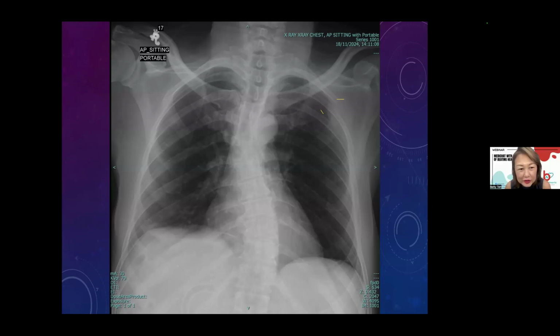Okay, everyone, please hurry up. So for this last X-ray of the day, come on, make our day. Okay, Arif Mokhtar said right fourth posterior rib fracture. No. Pleural effusion, right? Someone said left neck of femur fracture. No, that one will be the X-ray just now. I think came in late.